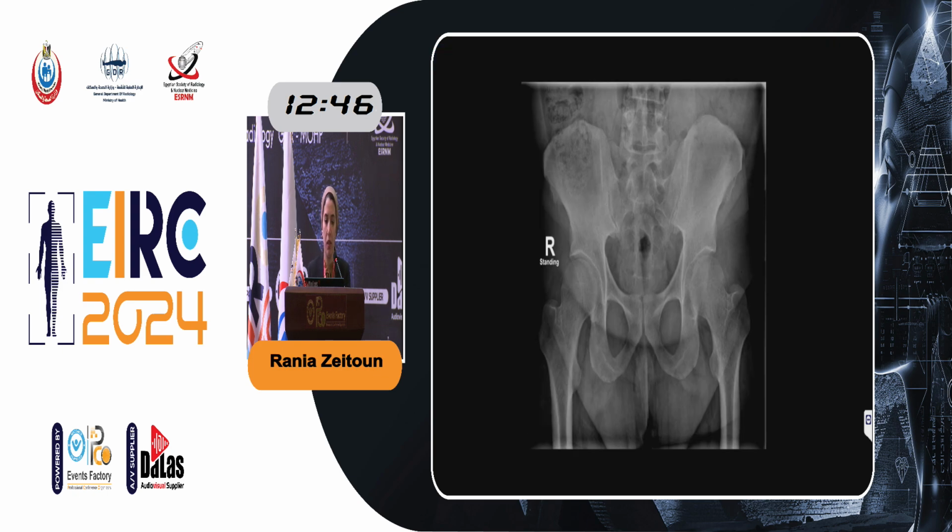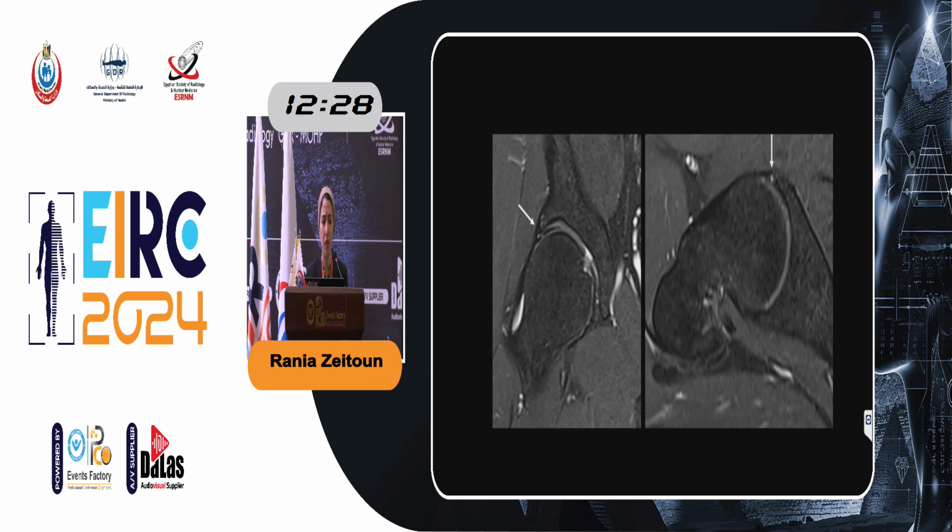Another example, plain X-ray of the pelvis and both hips, AP standing. And yes, there is a cam, but there is also an impression of some sort of dysplasia. So when we measure the lateral central edge angle, it is reduced down to 18 degrees, whereas the normal range should be between 25 to 40 degrees.